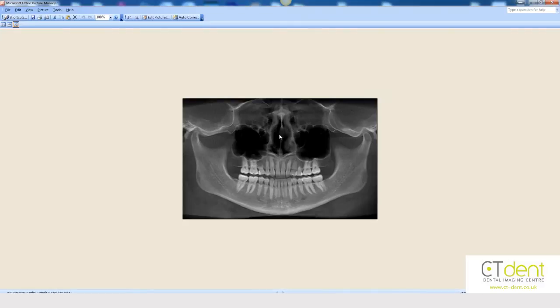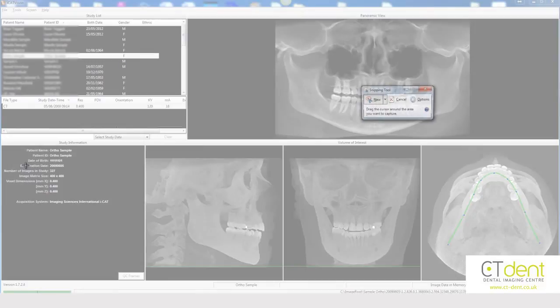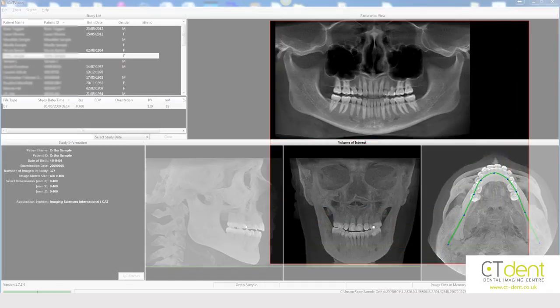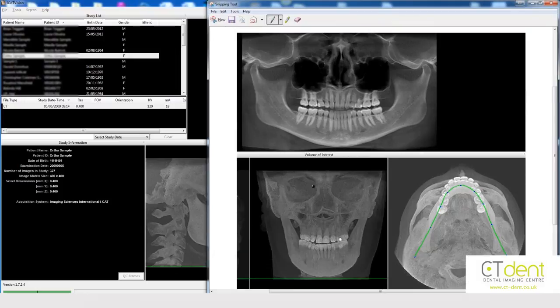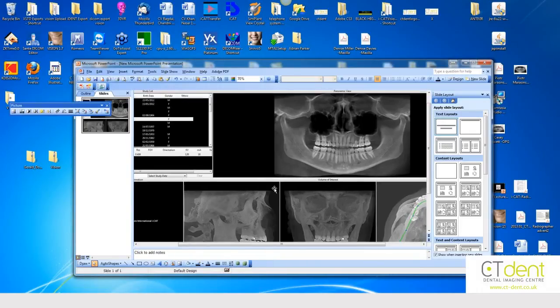If you are using Windows 7, another way of saving an image is to use the snipping tool. If you are not already using this tool, go to the Start button and type Snipping Tool in the search field. When it appears, click on the Snipping tool. This will grey out the screen and you can then select the region of interest. This selected area can then be saved as a JPEG or equivalent file, or copied directly into another document, such as a PowerPoint presentation or an email.